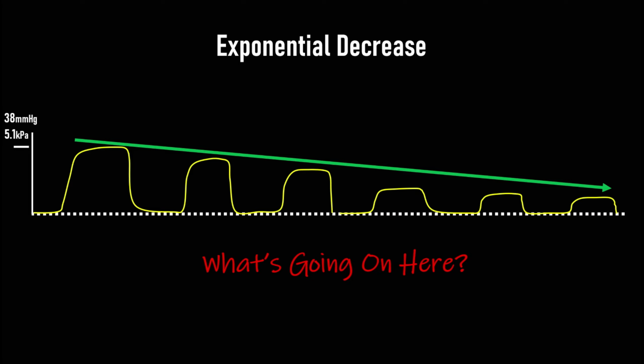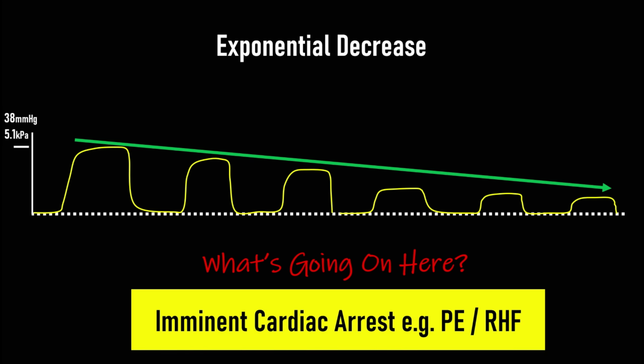And the reason for this is complete cardiovascular failure. There is a risk of imminent cardiac arrest. It might be caused by bleeding, it may be caused by acute right heart failure, it may be caused by pulmonary embolism. If you see this, you need to take note and assess the situation. Remember this trace of all of the traces that I have shown you.